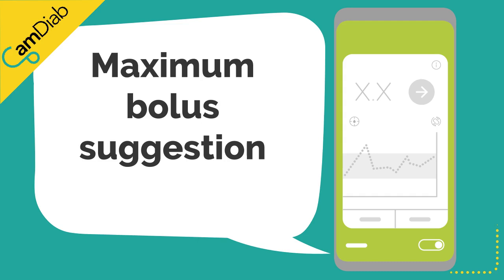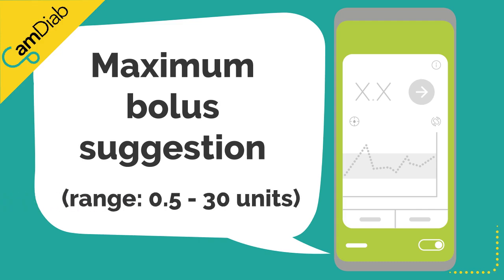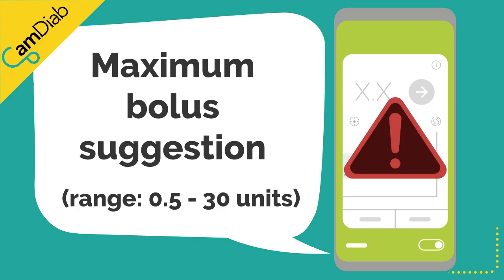2. The maximum bolus suggestion. This is the maximum dose of insulin that the bolus calculator will be allowed to suggest. If the calculated dose exceeds this limit, it will be capped at the specified maximum.